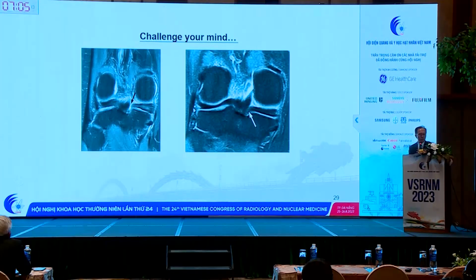This is a very important concept, because with the scope, tilting the angle to see the meniscal tear and then inserting the probe inside the tear is difficult. So the surgeon can usually overlook the meniscal fracture, especially in the posterior horn of the medial meniscus. It is a false negative, although they will not be happy because you argue with them. But it is the fact.